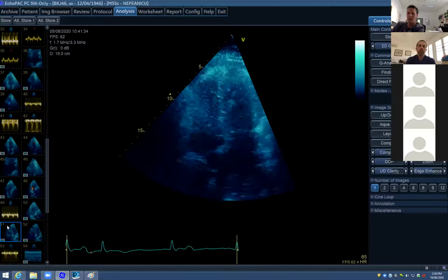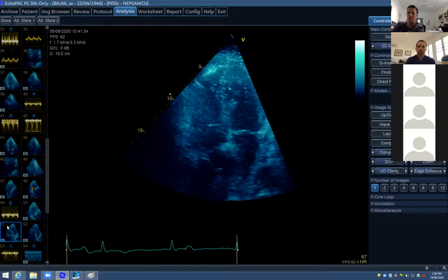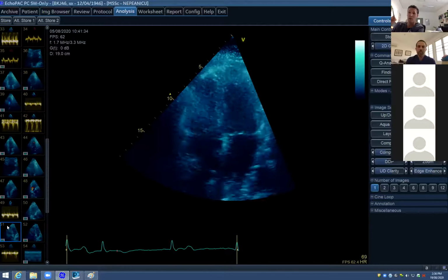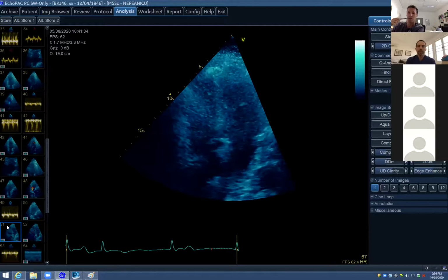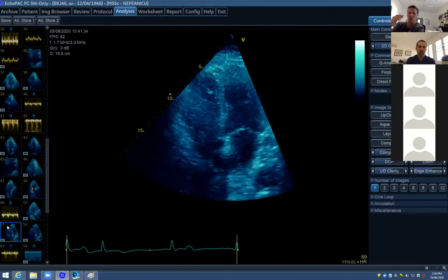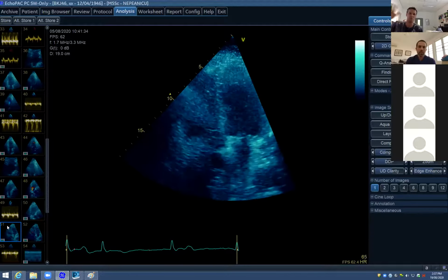Yeah, and give me the caveat. So what's the caveat with the apical 4-chamber view? The standard thing I say to people who are starting to do basic echoes is, if you think the RV is overloaded in your apical 4, your first thought has got to be: have I messed up my image? Have I foreshortened the image? How in this view can you see if you've foreshortened it? Let me ask Vishal, do you think we've foreshortened this image? It wasn't me taking these.